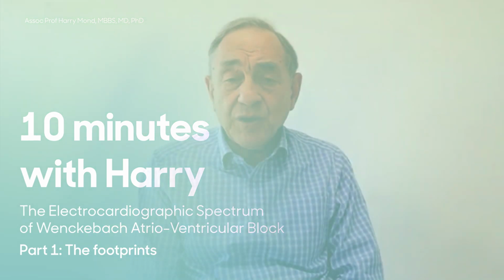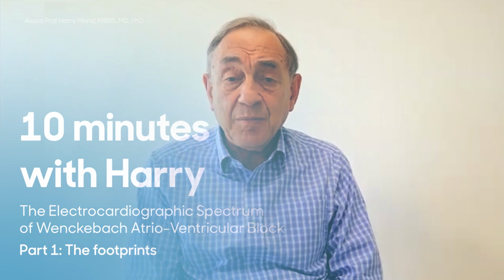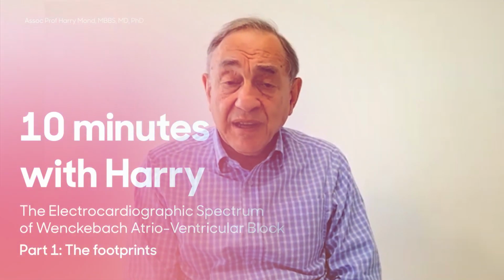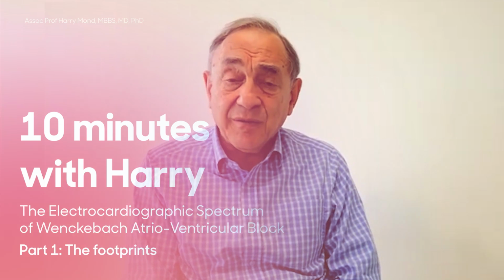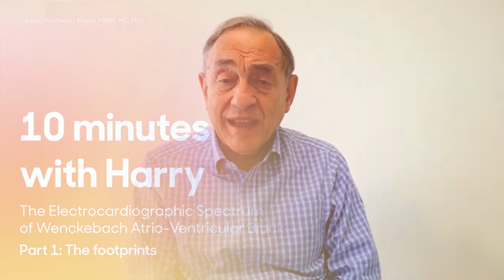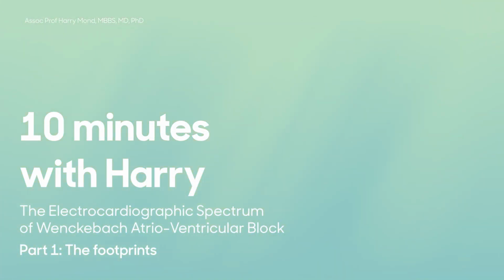For my next 3 sessions, I would like to talk about Wenckebach AV block. The first will be on the footprints, the second on the clinical features, and the third is atypical Wenckebach, as we usually see it on the electrocardiograph.